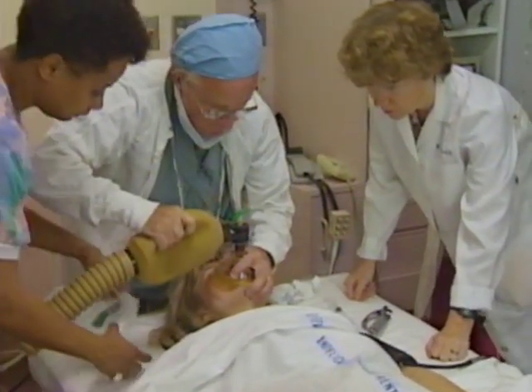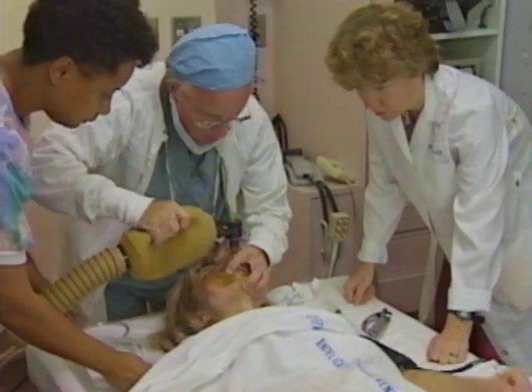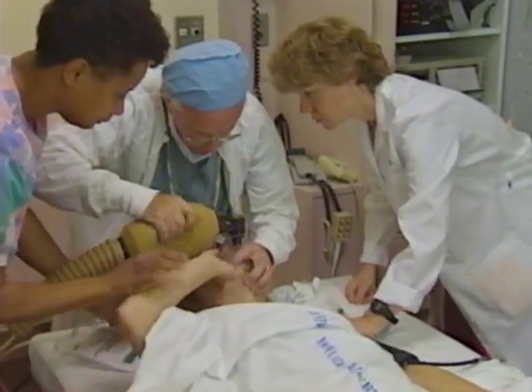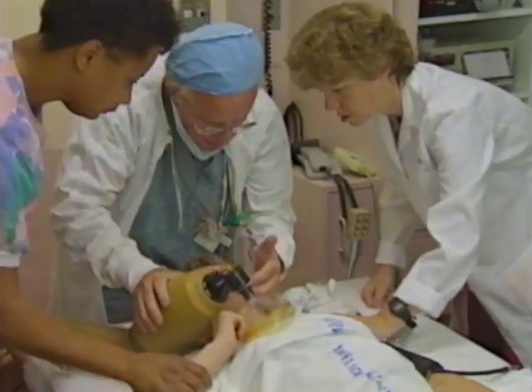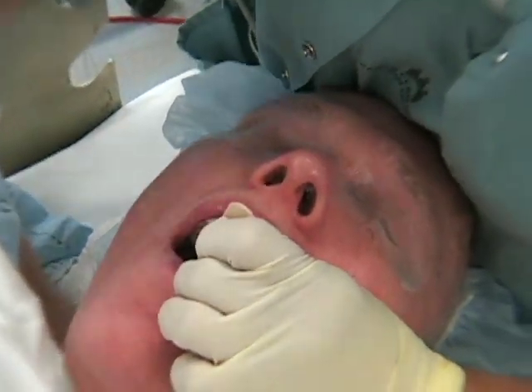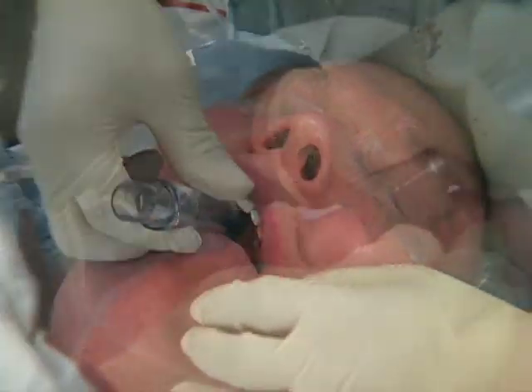The patient will often recover enough to breathe on his own before he's awake and aware enough to protect himself from aspiration. Always be prepared for possible vomiting. If you can't ventilate using a bag valve mask device, you may need to consider inserting an LMA or intubating the patient.